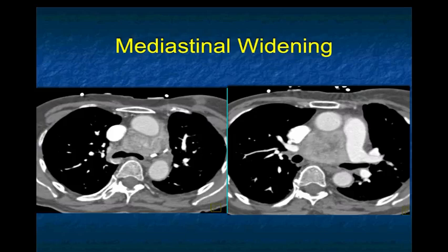Very good. Next case, mediastinal widening, incidental finding. Well, you see a large mass in the middle mediastinum. It's somewhat enhancing. There's a little bit of low density zones within it. You could again think of lymphoma. Lymphoma can involve the anterior, middle, or posterior mediastinum, or all of them. It doesn't look like a duplication cyst, which you can get in this location. It looks like a mass or adenopathy.